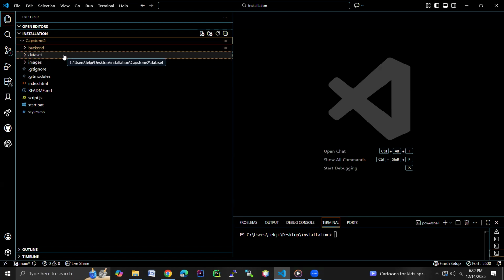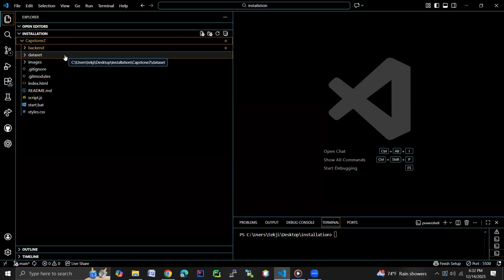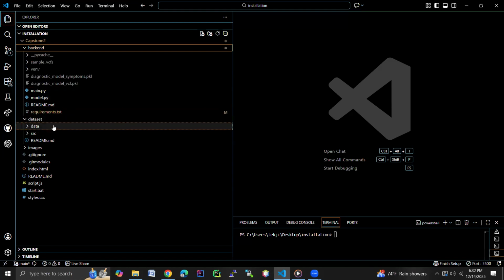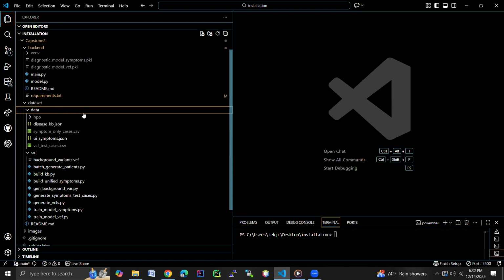What's really important to note is the data set is very large, therefore, the data set will need to be built by the user if you are starting from scratch. I'm not starting from scratch since I have the project locally. However, we will go through it very quickly.